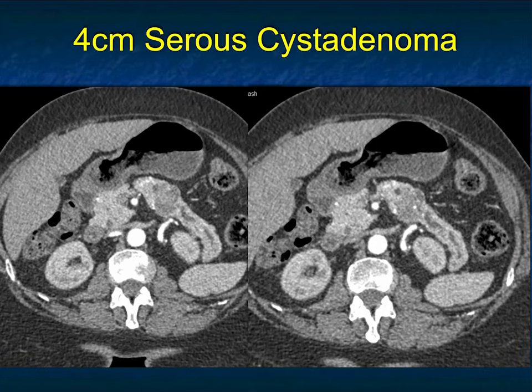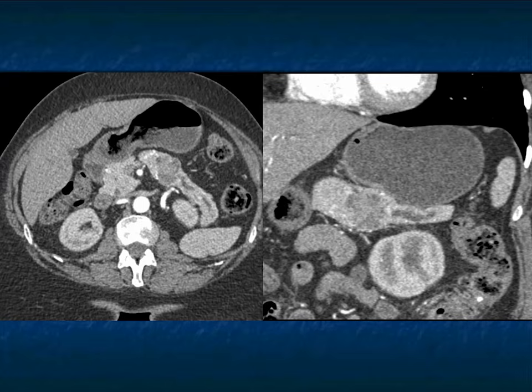Now, I have to admit, with the microcystic type, when you look really quickly, you say, oh, this lesion looks worrisome to me because there's a dilated pancreatic duct. I mentioned to you that these lesions don't arise from the duct, but mass effect can compress the duct. There are some faint calcifications present, but you would look at this lesion carefully because you would worry, could I be missing a carcinoma with a dilated duct and the duct cutoff? You could see it very nicely here as well. This patient would go for EUS, and you get a biopsy, and you make the right diagnosis.